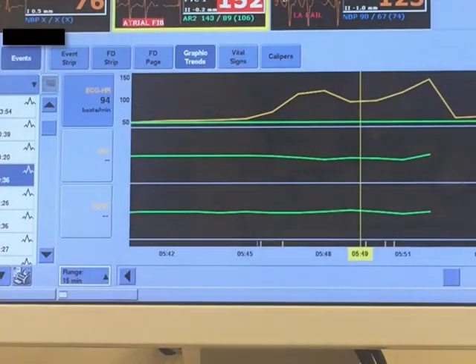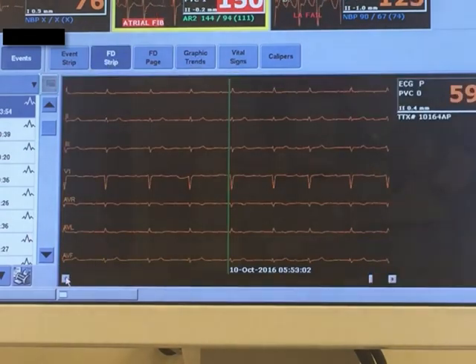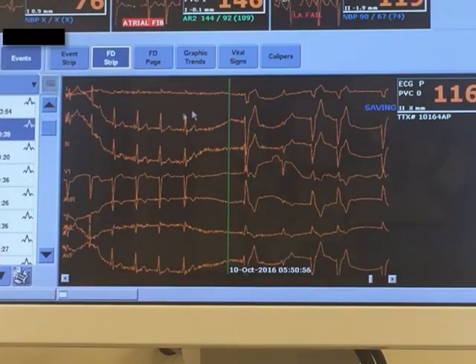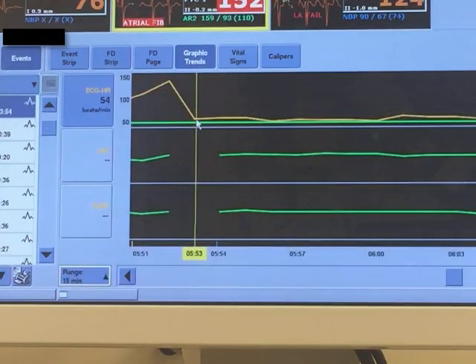Finally, moving the cursor to the approximate termination of the arrhythmia and then scrolling through the waveforms again in the FD Strip can allow one to precisely identify the offset of the arrhythmia. It is important to identify if an arrhythmia is terminated by a premature beat. Additionally, the offset of tachyarrhythmias should also be inspected for post-conversion pauses or post-conversion bradyarrhythmias, which are fairly common. The process for moving the cursor and inspecting the onset and termination of an arrhythmia is just as important as inspecting the arrhythmia itself and should be repeated for every suspected arrhythmia.